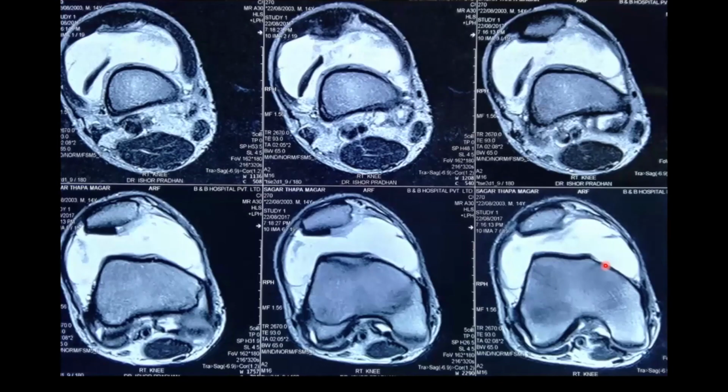We should not only focus on ligaments and meniscus. We have to look for various cartilaginous lesions as well. The most common traumatic condition is osteochondral fracture. Usually, osteochondral fracture occurs from the femoral trochlea or from the patellar facet. So this is the patella, and this is the cartilaginous facet of the patella. This is the medial facet, and the lateral facet has been fractured over here, and this fractured osteochondral fragment is floating over the hemarthrosis thus formed.